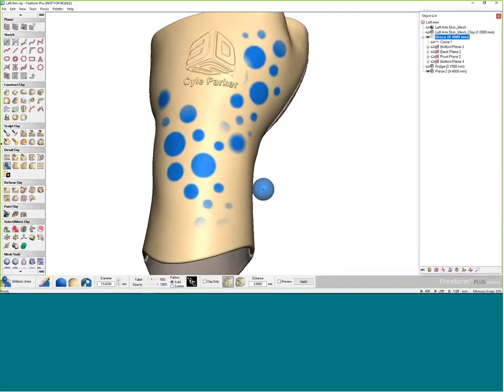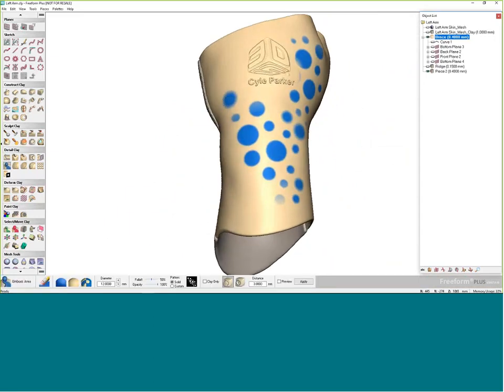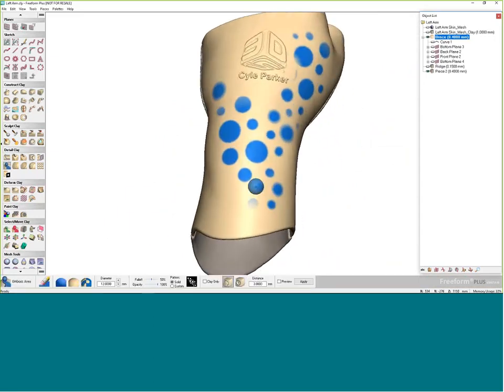Okay, maybe make a couple smaller ones to bring this whole thing together. One more big one. Right there. Okay. That looks pretty good. Oh, wait. All right, that looks pretty good.